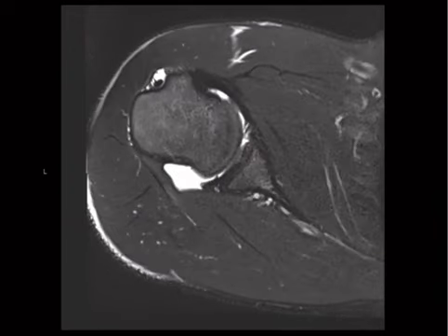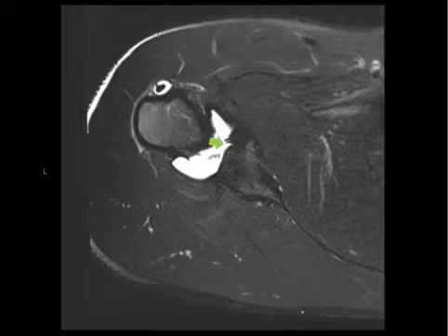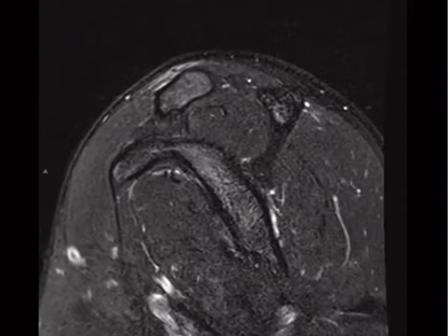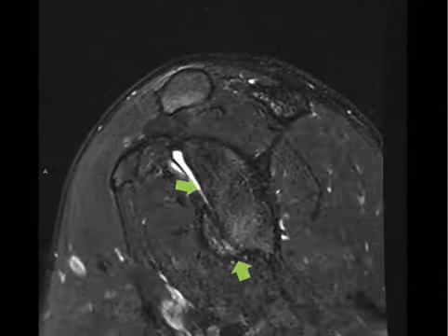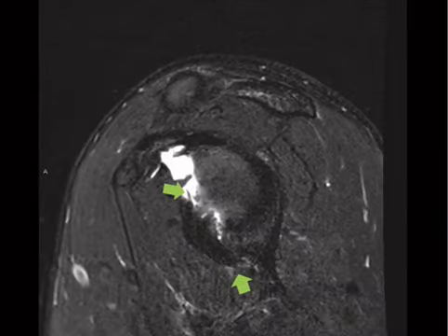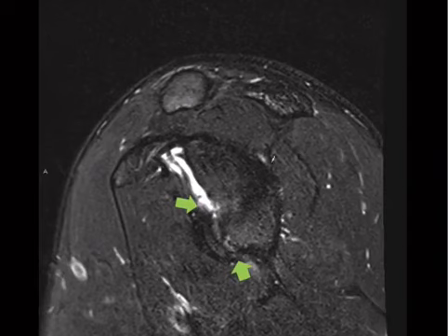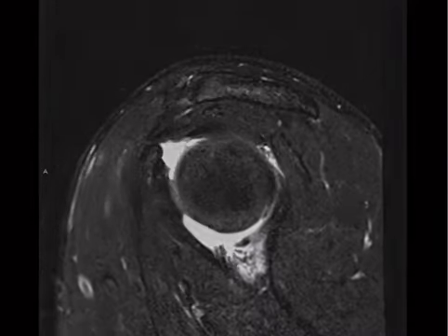That part's torn. Probably a little easier to show in this plane. See that? Anterior, inferior. This thing's sort of supposed to look like a pear right here. We've got that broken off.